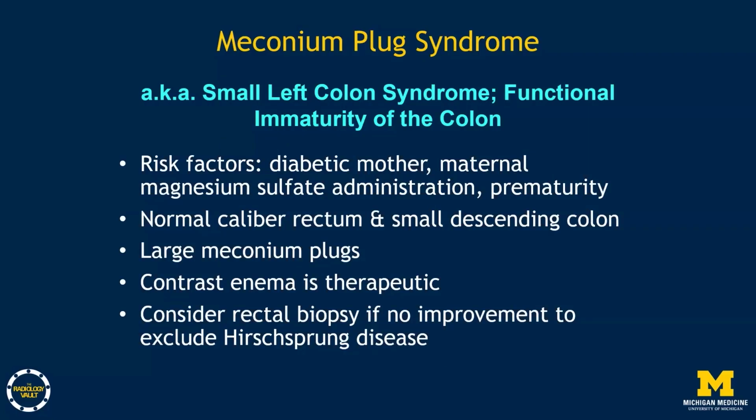Moving on to meconium plug syndrome, it is a functional immaturity of the colon. It is also referred to as the small left colon syndrome. I like that name simply because it describes what you're going to see. Now, the risk factors for meconium plug syndrome or the small left colon syndrome include infants of diabetic mothers, if there had been magnesium sulfate administration during pregnancy, and prematurity.